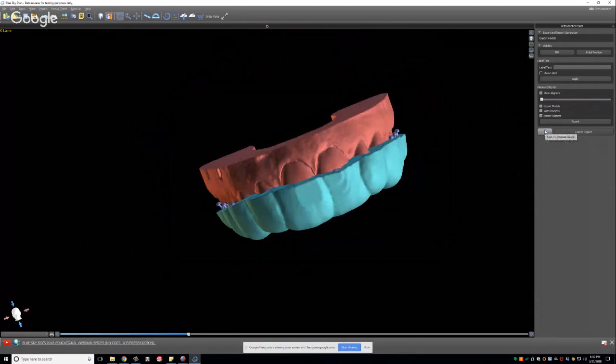I'm just going to go ahead and go back. Hopefully, I don't need this. Well, sure. Let me open that folder up. Let me open up one of these models.